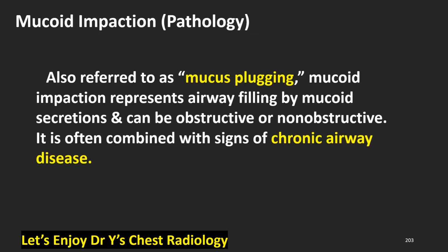Mucoid impaction pathology, also referred to as mucus plugging. Mucoid impaction represents airway filling by mucoid secretions and can be obstructive or non-obstructive. It is often combined with signs of chronic airway disease.